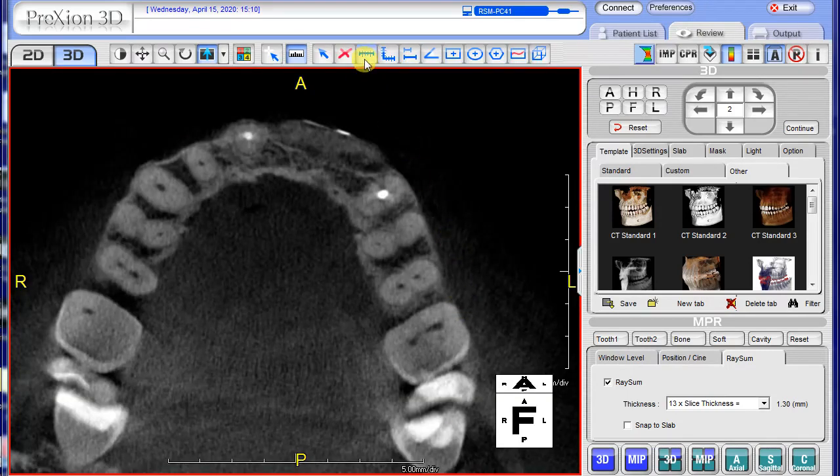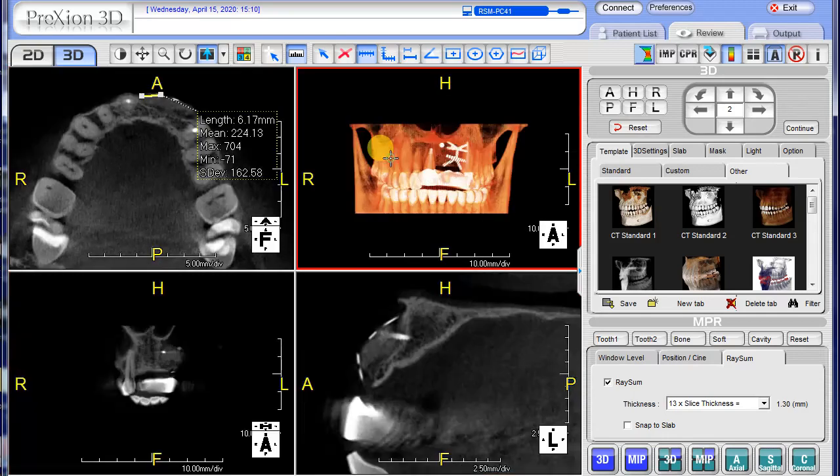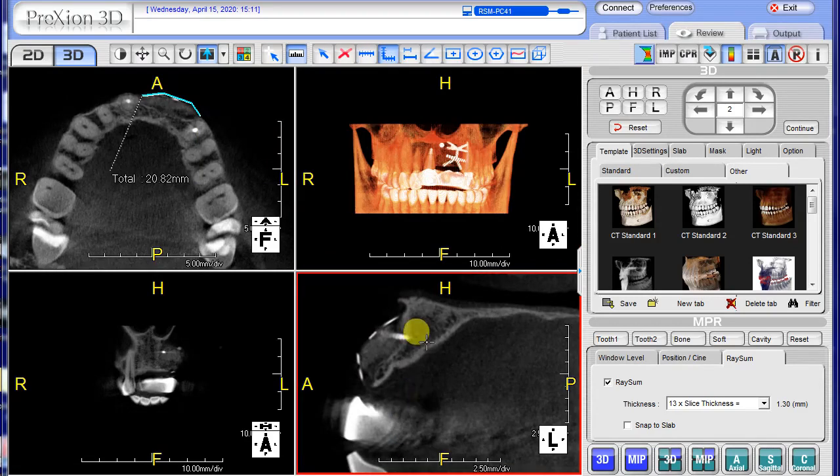The next tab is called line segment. Click it and it allows you to drag and click and make a series of points along a curve. When you're done, double click it. When it's double clicked, you can see the number of total length, and then you can see the segments, and it's from this little tab that you get these measurements.